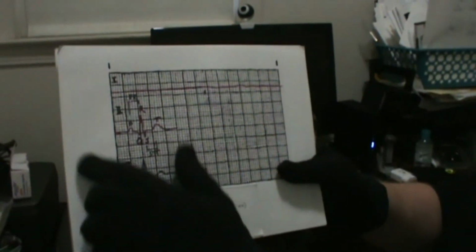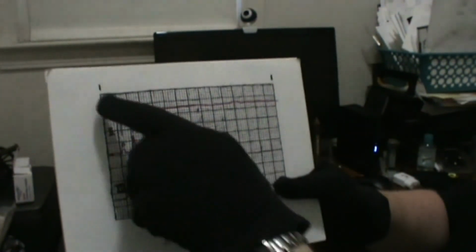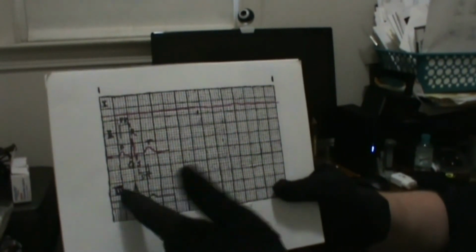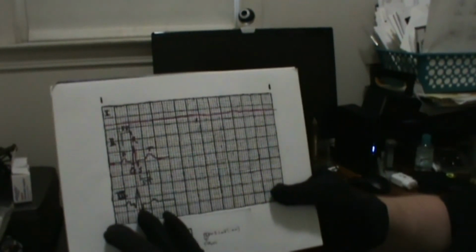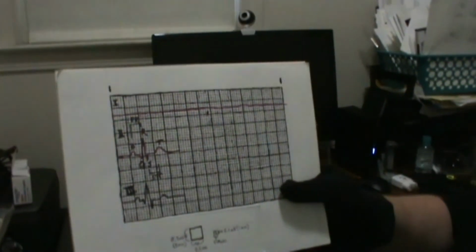A final important thing to remember about an EKG printout such as this is that there's going to be at least 3 channels with which you're going to be doing your comparison. These typically are 1, 2, and 3. However, some medics prefer to substitute lead 1 for AVF.